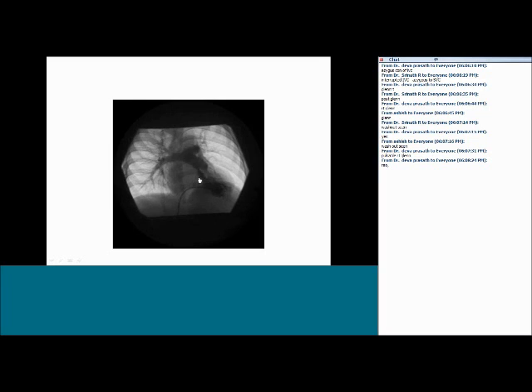It has played enough, it doesn't want to play anymore. Image is breaking, okay. Absolutely correct. Infundibular PS with VSD. Most likely it's a tetralogy of Fallot.